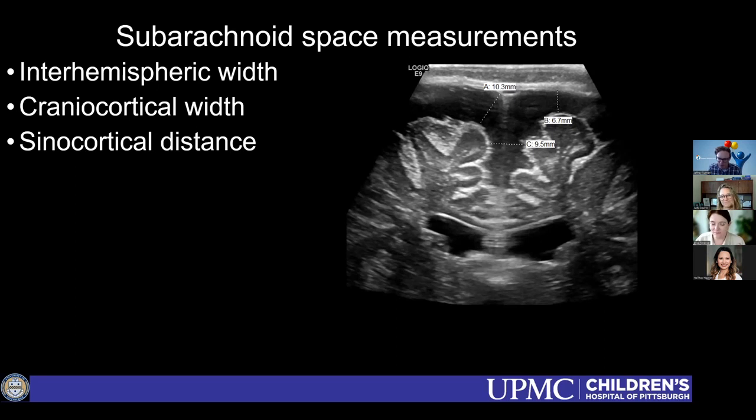And I think one other part, even in this image here, the 2 measurements are going to be different on each side. If you measure the width on the right side, it's going to be bigger than what you have measured here. And I don't think that's really accounted for in the original papers that gave this data. So we just decided to measure the bigger of the 2 sides, but I don't know what the right answer is to that either.